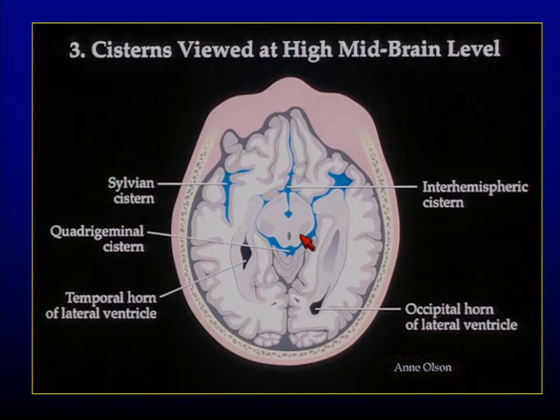One is that once you lose your circummesencephalic cistern, this is the next one that can go. So if, again, somebody does a cranie on me and you start pushing down on my brain and do serial CTs, first thing I do is I lose that circummesencephalic cistern. That's the early warning system. Then I lose the quadrigeminal cistern. That's the late warning system. That's someone who's having increased intracranial pressure and rostrocaudal herniation. This is where I'm going to see that happen, is loss of this W-shaped quadrigeminal cistern.